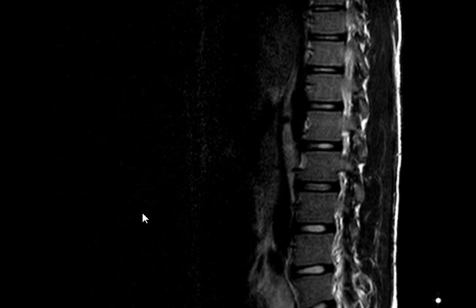If you have no fat signal intensity at all, then it is much more complicated. You have to put ependymoma, metastasis, still dermoid, not necessarily to have fat in it. Sometimes there is no fat. You have to put the whole differential diagnosis of spinal masses or medullary masses. You have nothing else to go on. But as long as you have fat, it is a dermoid.